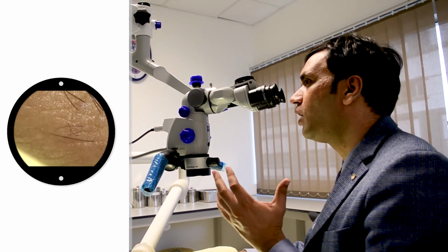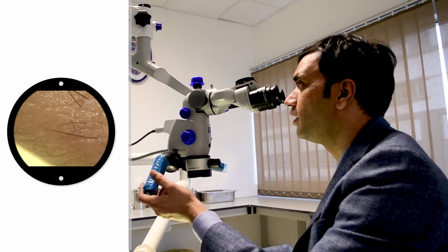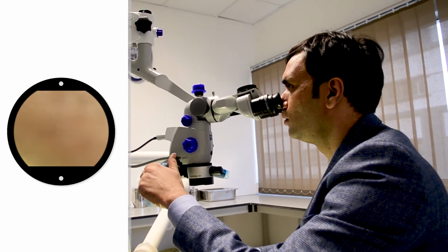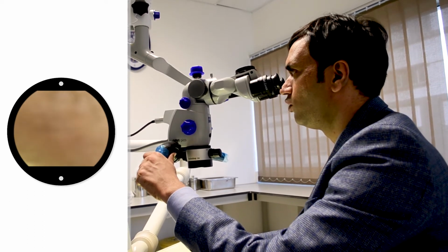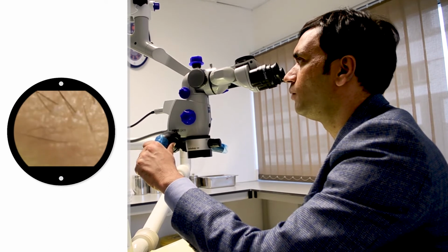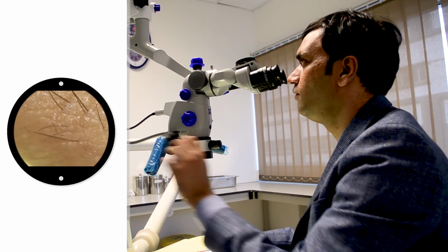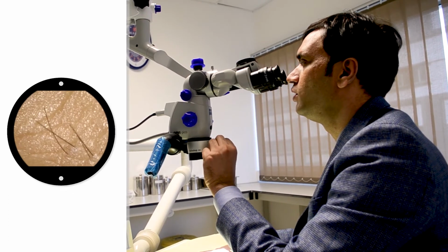Now I just want to show you how your movement, if you change, will affect the whole thing. You see the slightest movement of my microscope. If you see on the screen, the whole thing got affected. So you should be very careful about movement of this particular thing. So this is what I was mentioning. If there is any movement, again you have to focus properly and slowly fine tune it.